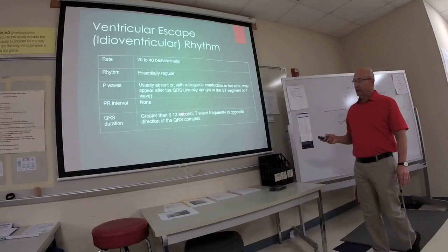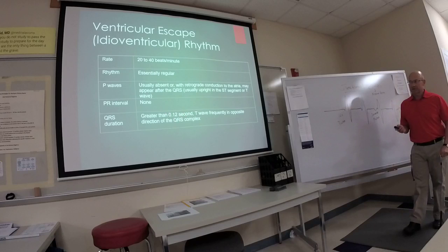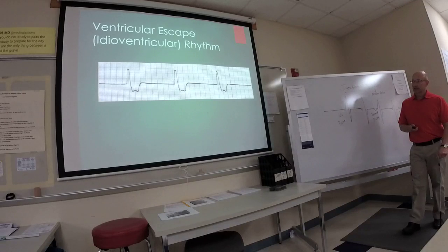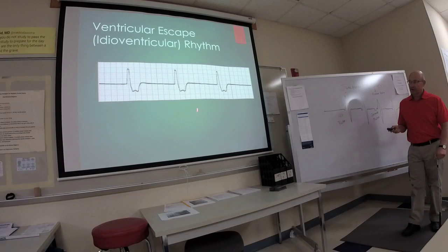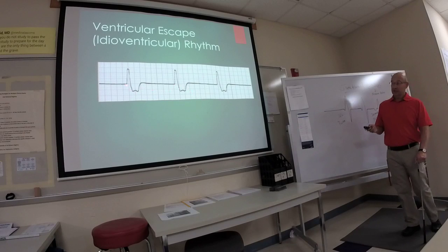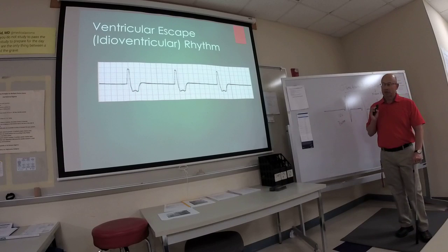It may or may not have a P wave. Definitely going to be wide and bizarre. All these ventricular rhythms are going to be wide. So the rate is 20 to 40. Well, this rate? Oh, this is 30.